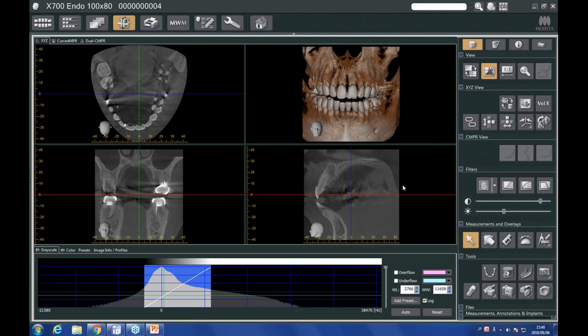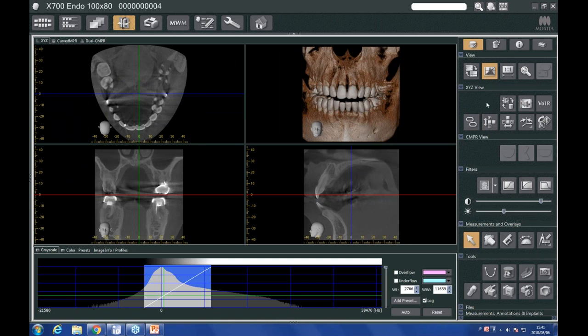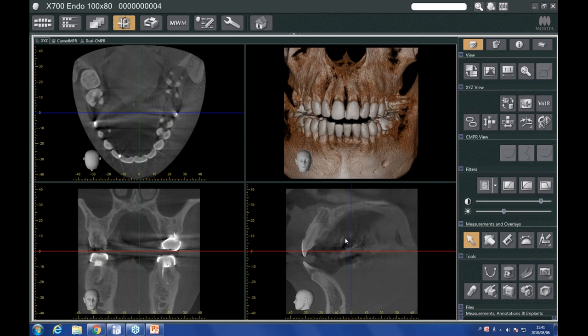Now, when I'm finished with adjusting my contrast, I usually want to just get this histogram window out of my way, because now the images are adjusted and I just want to focus on the actual image data itself. So this button up here that you can see is highlighted. I'm just going to click this and that's going to hide my histogram view. If I ever need it back, of course I can click it again and bring it back. So it's just out of my way.